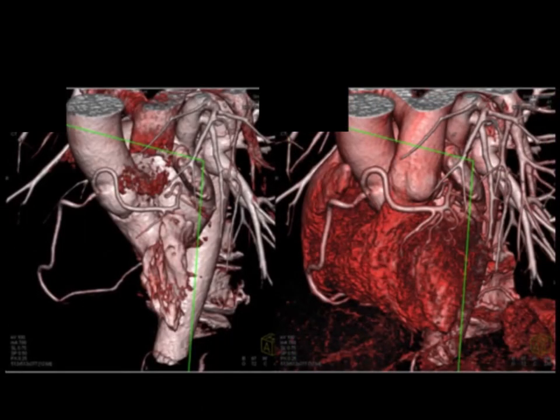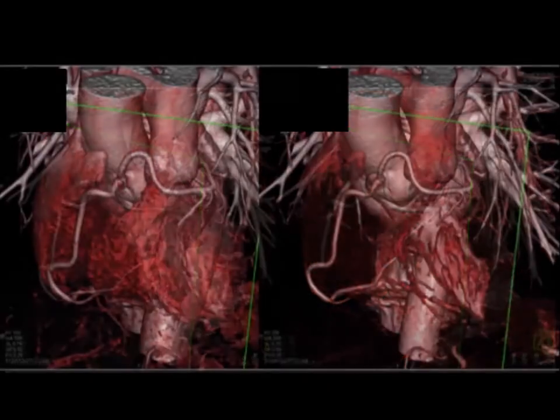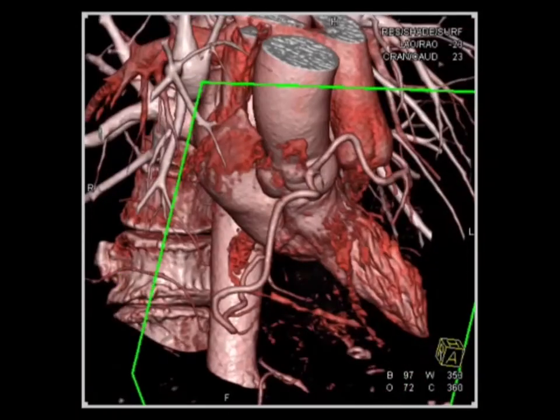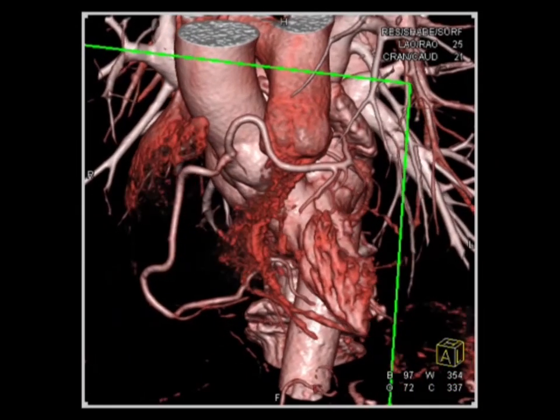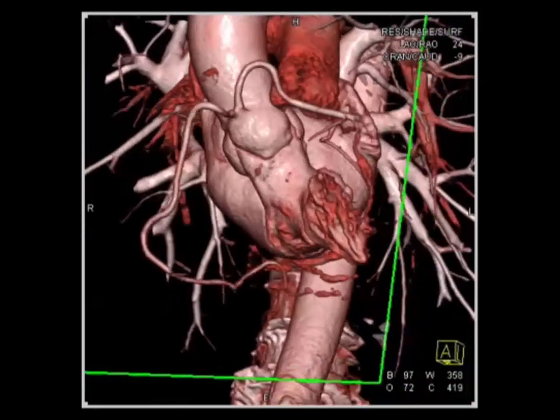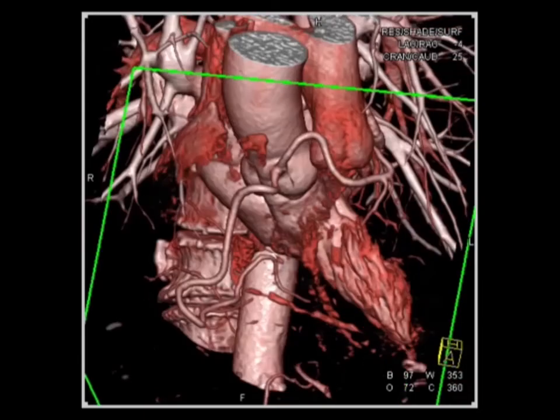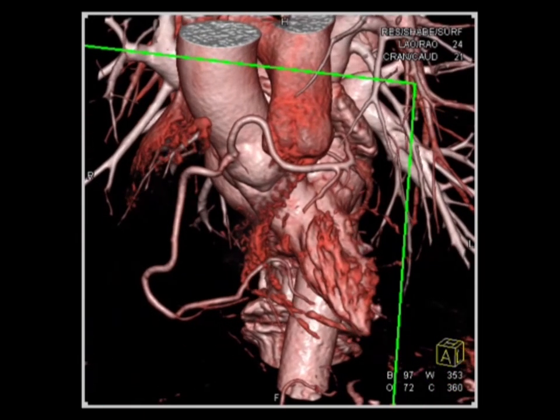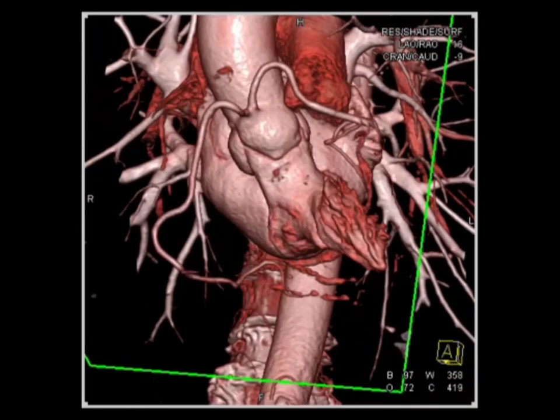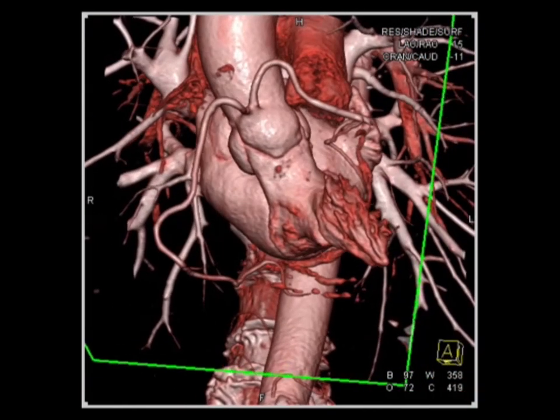Again, this brings back the point I always make about color. Although grayscale works well, with color you get an added dimension besides just the natural color. You also get a good feel in 3D. I think when we look at our eyes and how we see things, there's a certain amount we see in black and white, but in color, particularly with depth perception and orientation, you see a lot more, and it's much easier to manipulate the data in color and do it well.